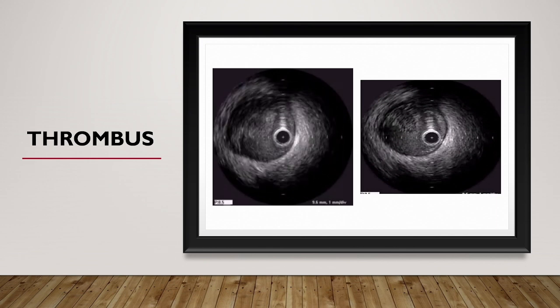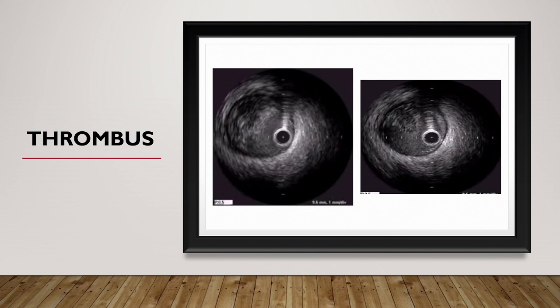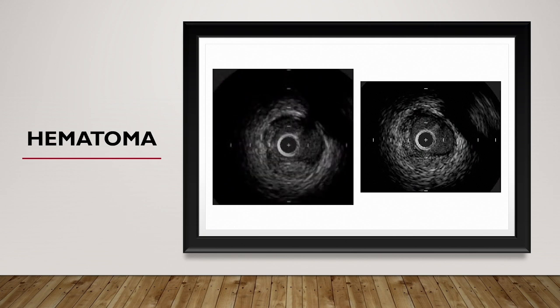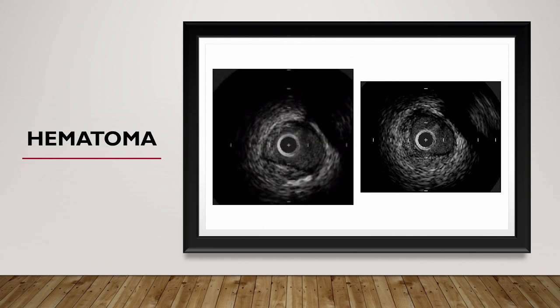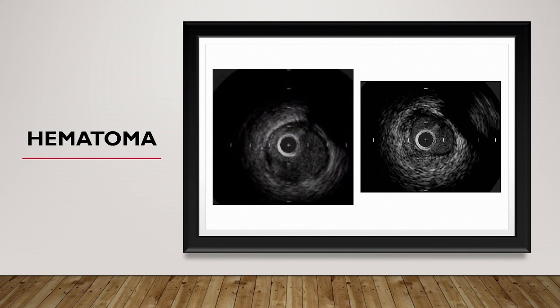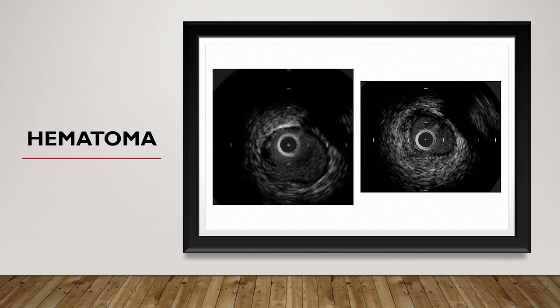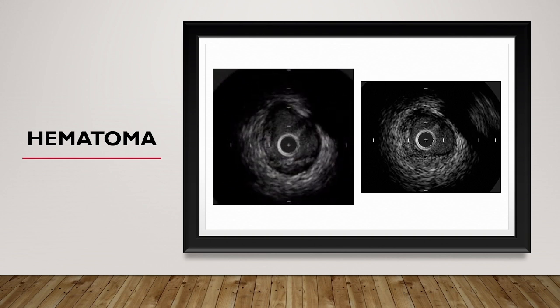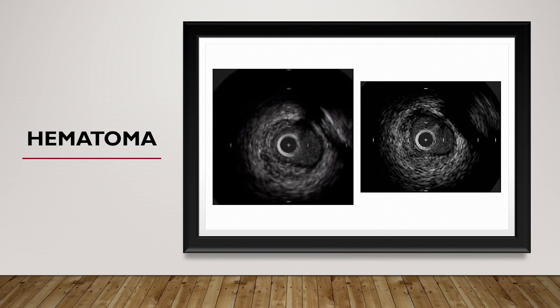If you are not recognizing thrombus, not preparing your vessel with vasodilator or other measures, you may land into trouble. And plaque erosion can be identified by IVUS by this thrombus. If there is no major disease or plaque rupture, one can keep these patients on medical follow-up and bring them back for imaging or an angiogram, and stent can be avoided.